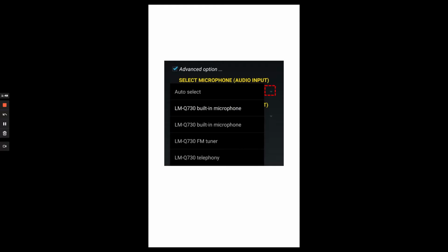To see the list of devices for recording or the input stream, please press the down arrow. A list of available devices appears. The number and names of items in the list are different for each smartphone model. In the Audio Input Source selection drop-down menu, it is recommended to use the default option, the first built-in microphone. This selects the main built-in microphone on the phone.